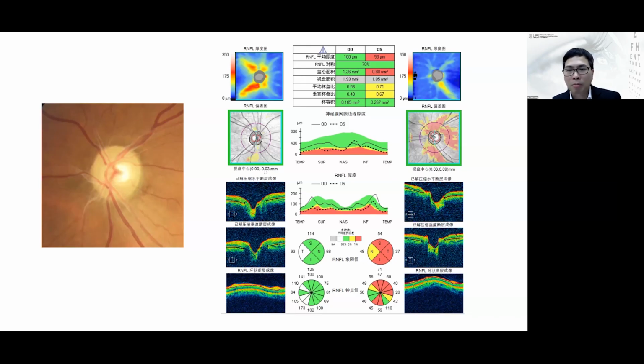ROTA, or retinal nerve fiber optical texture analysis, the technology I just mentioned, is also extremely helpful in the diagnostic evaluation of the myopic optic disc for detection of retinal nerve fiber defects in glaucoma.